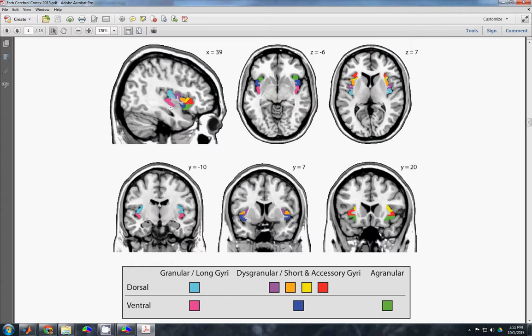You don't have to worry about that part so much. The important thing is we're trying to recreate these divisions as we map out the insula, and I'll take you through over the next few minutes exactly how I'd like you to do that.